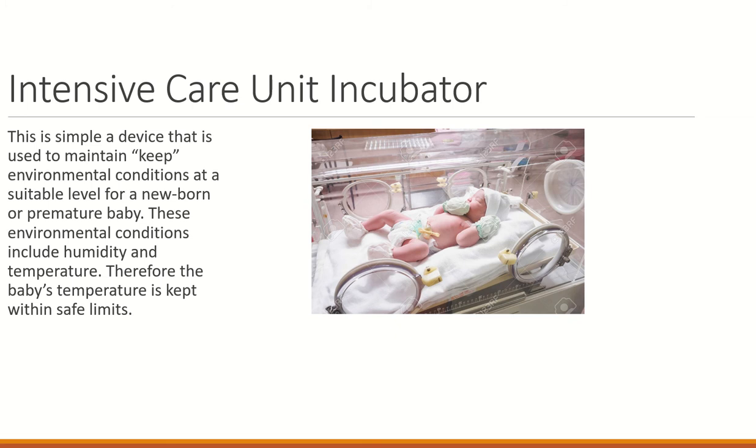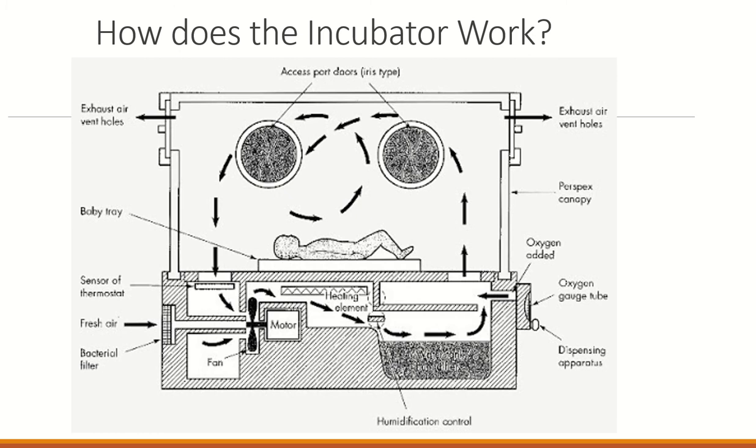Now, I first want to look at temperature, which is going to be the emphasis of the video. How is the temperature kept constant within an incubator for a baby? So, how does the incubator itself work? Now, I know that this little diagram may look a bit confusing and overwhelming, but let us take it step by step. Now, on this side, as you can see, you have fresh air. There's a bacterial filter here that ensures that pathogens do not get into the baby. There's a sensor here, or a thermostat. I want to also introduce the word thermistor to you at this juncture.